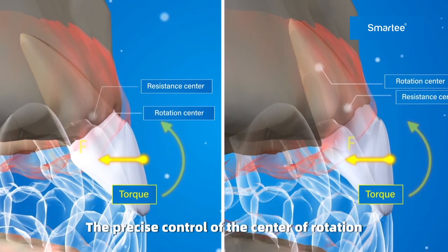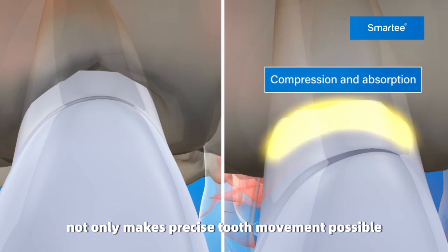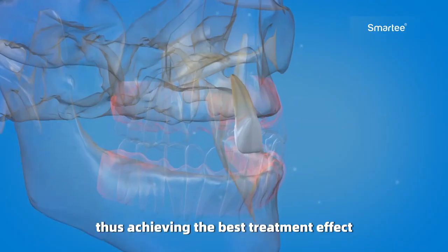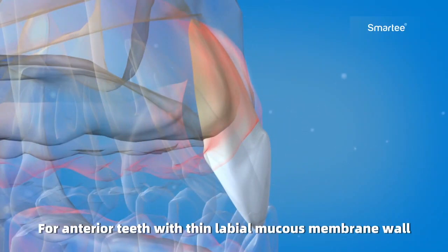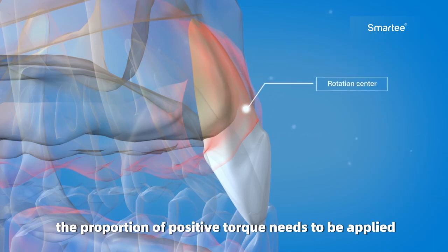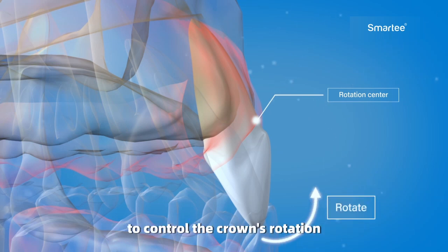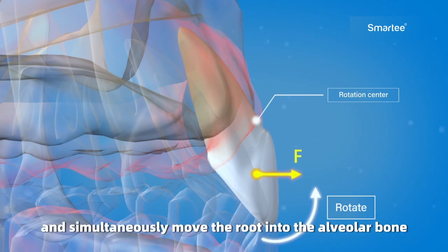The precise control of the center of rotation not only makes precise tooth movement possible, but also avoids bone fenestration and bone dehiscence caused by improper tooth movement, thus achieving the best treatment effect. For anterior teeth with thin labial mucous membrane wall, the proportion of positive torque needs to be applied. The intelligent rotation center can be placed at the cervical area of the labial side tooth to control the crown's rotation and simultaneously move the root into the alveolar bone.